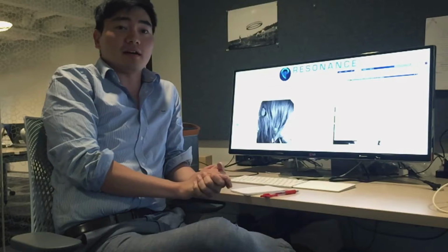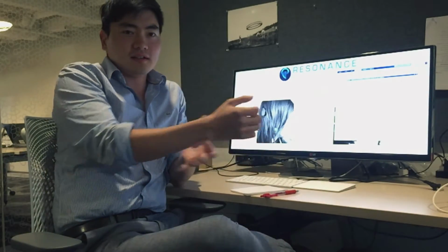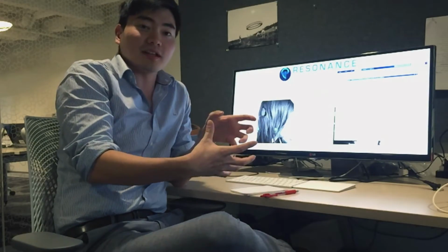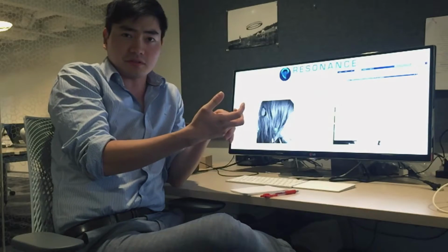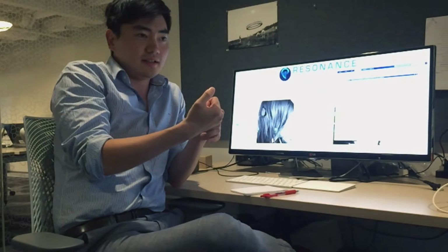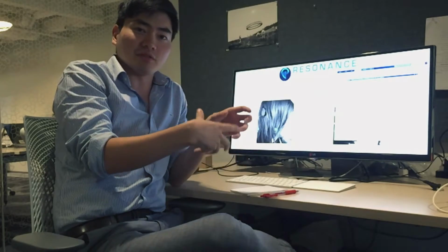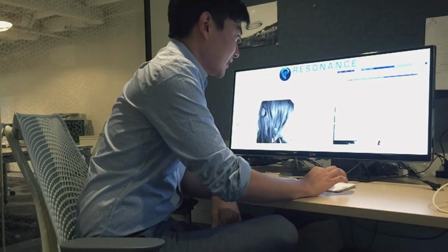So what I'm going to do now is play a couple sentences. The first, recall, is a simulation of an unideal cochlear implant fit where I've removed some of the auditory filters corresponding to electrodes in the lower frequencies. And the second is the optimized version where we've compensated for that unideal fit. So let's take a listen to see how those sound.